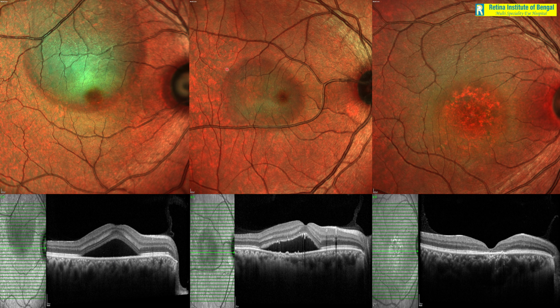Now here also you can see this area where the retinal detachment is there, it is standing out clearly, it is demarcated and it is appearing greenish. But by comparing these two images, we can make out that the greenish tinge is much less in the middle compared to the image on the extreme left. Now this is because this is a case of a persistent CSC, and we know in persistent CSC with time the serous detachment sort of reduces, and in its place we expect RPE changes to come up. So you see these red dots.